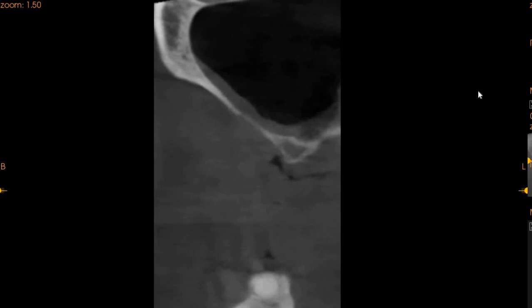You can see there's a cavity present in the palatal aspect with severe bone loss as well, and the distobuccal root is also extremely vulnerable as we have cortical bone loss. There's fenestration here as well. In the second molar region, again, the ridge thins out and shortens extremely.